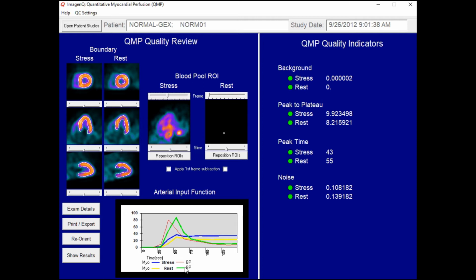Any time that these might get lower may indicate some problem with the location of the blood pool ROI or the generator. There can be occasions at the end of the generator life that these numbers might slip below the factor of 6 that we are hoping to see. This may not necessarily negate the value of blood pool imaging, but it can cause a reduction in accuracy.